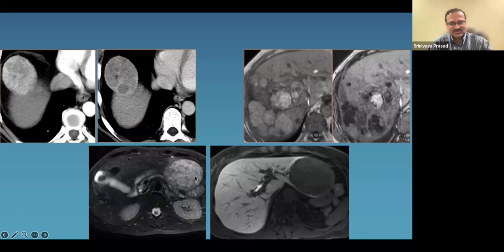And the typical HCC shows a heterogeneously hyperintense to intermediate signal intensity on fat suppressed T2 weighted images, and typically does not show contrast retention. Only the small, well-differentiated hepatocellular carcinomas have a tendency to show contrast retention on hepatobiliary phase images.